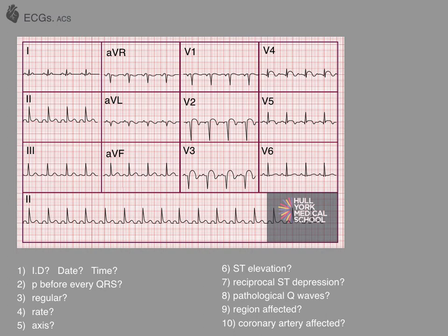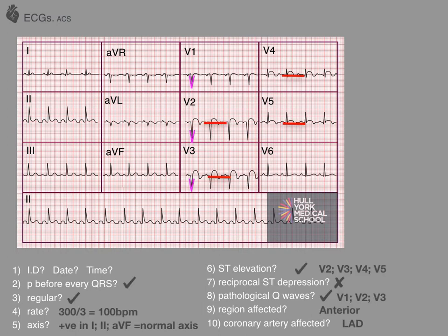Next ECG. Again, at this point you could pause the video and work through the 10 questions regarding this ECG yourself. Check that you've got the right ECG for the right patient, and again, check the clinical context of this ECG.